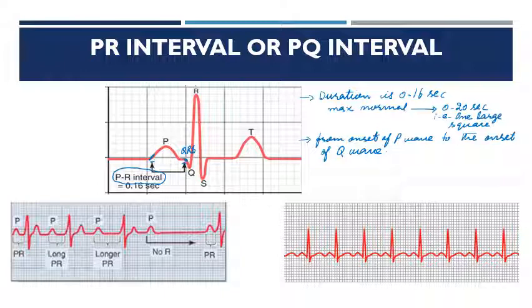The PR interval becomes prolonged as is seen in this first diagram.